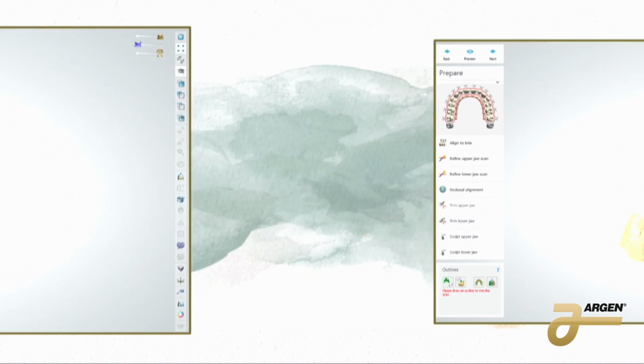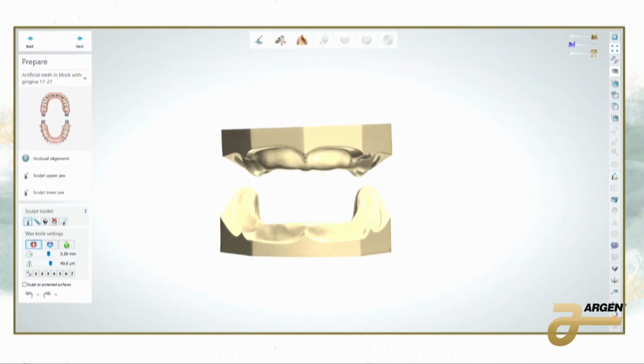So the first thing that you get in your lab, if you're going to be getting anything digital or start digital or get models, is something that you can scan into your software or something that has already been scanned for you. So the very first thing before we can do anything is analyzing our data. In 3Shape, if you are scanning in models, you have a couple options over here, and you can sculpt your models. These are already models that have been poured. We have already gone through the analog process of making sure this is a good impression, pouring this up, scanning this in.